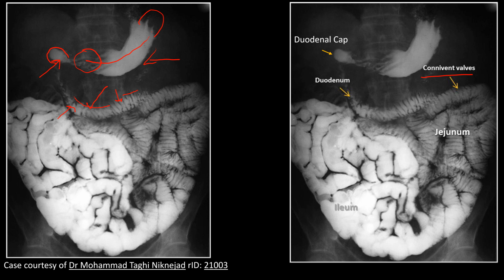The greater part of the small intestine presents a feathery or floccular appearance because of the presence of transverse mucosal folds and their rapid movement. This is known as valvulae conniventes. However, the terminal part of the ileum is comparatively without such mucosal folds and does not show such valvulae conniventes.